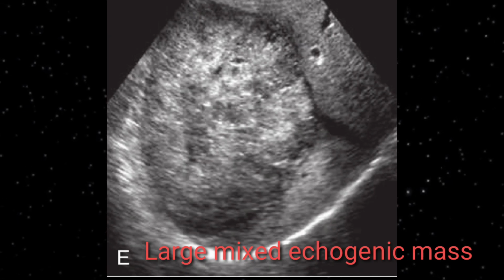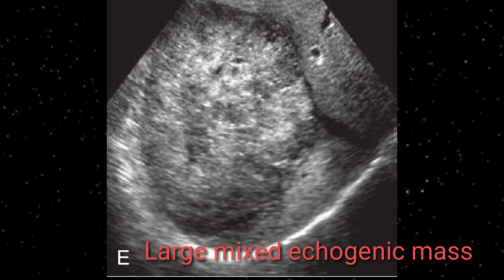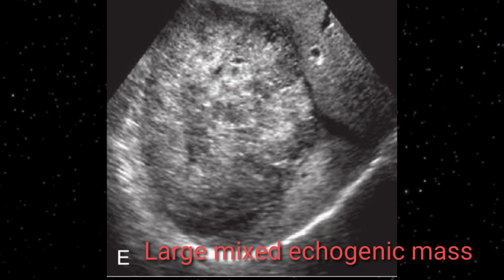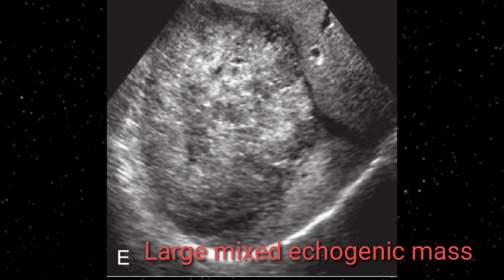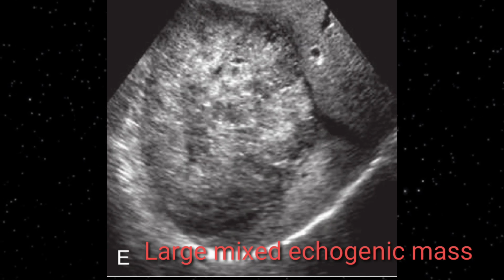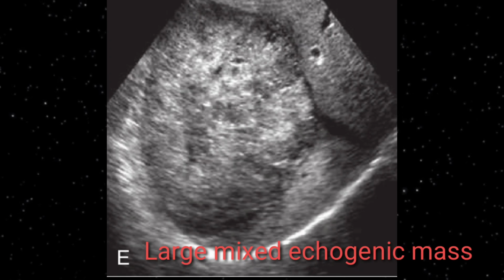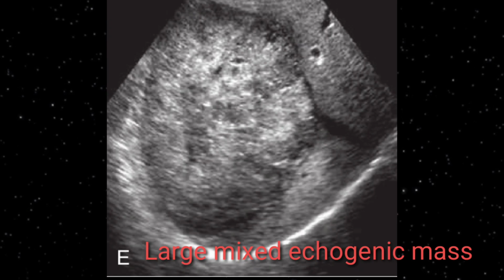Have a look and you will see a well-defined large mass with mixed echogenicity. Mixed hypoechoic and hyperechoic areas are seen within the tumor. Margins of the tumor are slightly irregular. The tumor is large enough to occupy the right lobe of the liver.